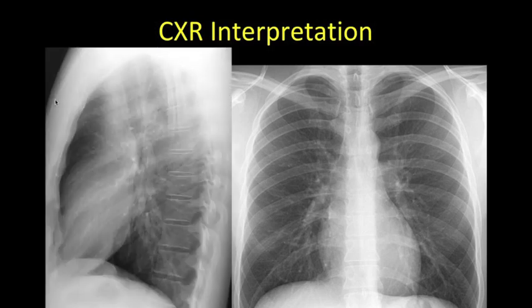A lateral chest X-ray can be approached in a similar manner. Scrutiny of the anterior chest wall, the sternum, the upper abdomen, posterior ribs can be made in addition to the trachea. And then evaluation of the lungs and all the normal interfaces, including the hilar contours, pulmonary artery, the right pulmonary artery, and the infrahilar window. Lesions that are overlooked oftentimes overlie the spine because of the number of osseous structures in addition to the cardiac silhouette, so attention to these regions is very useful.